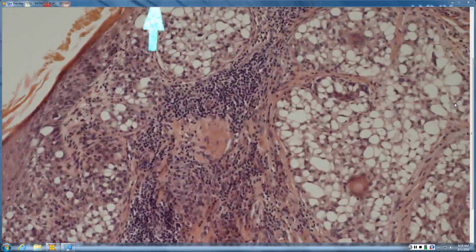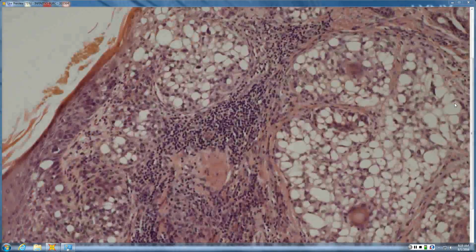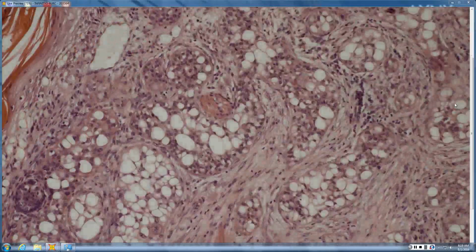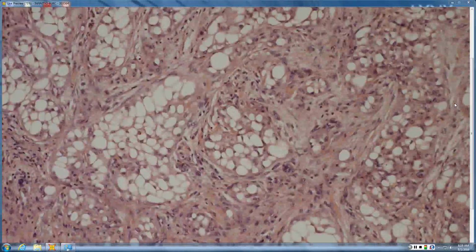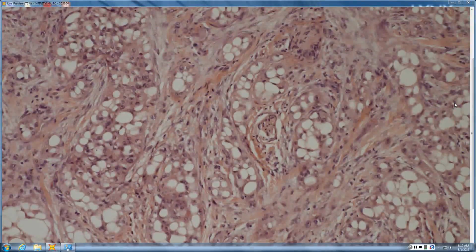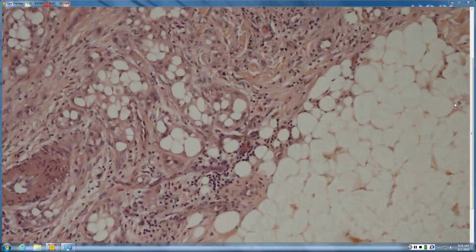Are the clear cells just in the dermis or in the epidermis as well? Yeah, they're also in the epidermis. So that limits your differential a little bit. It could be an epidermotropic tumor, or it could be something arising from the epidermis. I hear a lot of people saying it looks sebaceous. So sebaceous would have microvacuoles, so cells that have lots of tiny little vacuoles in them. Many of these to me look like they have one big vacuole that is more signet ring-like.